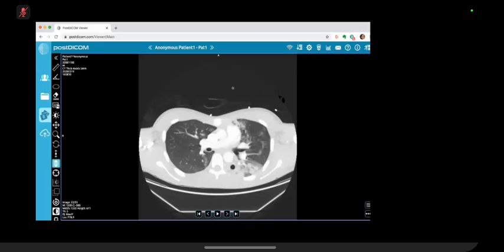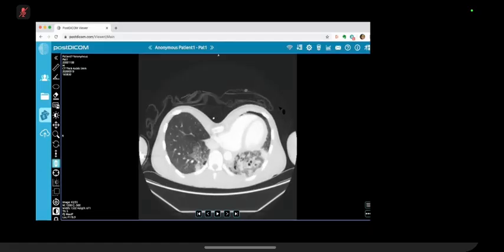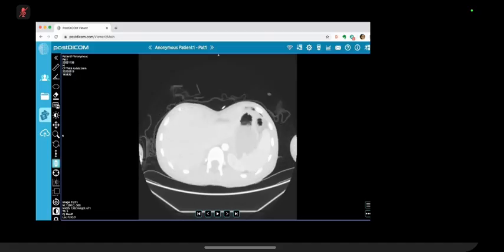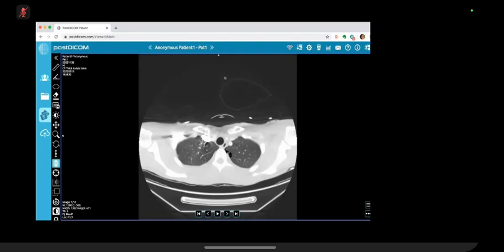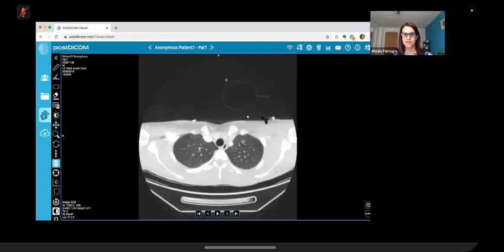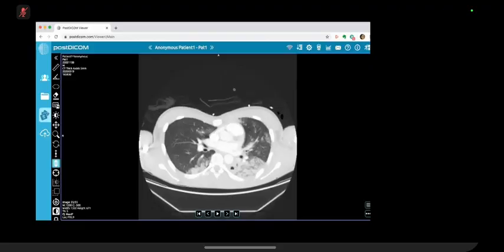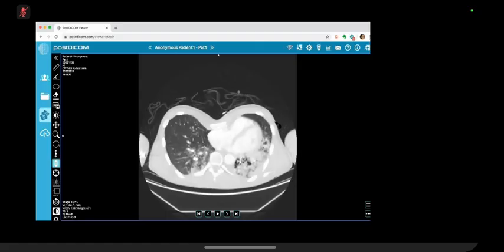Okay, so I assume this is contrast enhanced CT of the chest. Yes. I can see bilateral multifocal consolidation patches as well as ground glass opacities, more on the left basal segments, as well as small pneumothorax, left-sided. Yes. There are small cystic areas posterior to the heart and maybe lateral to the descending aorta.